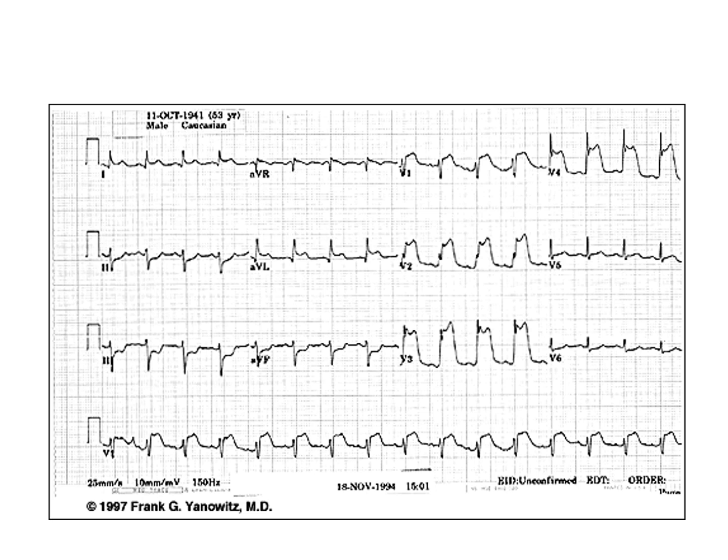So this is an example of a predominantly anterior MI. So if we look at leads V1 to V4, we see very prominent and large ST elevations. Now again, as we mentioned, the mirror image of the anterior field would be in the back. So the posterior leads, which we don't routinely do, but if we did a 15 lead, we would expect to see some ST depressions there. In addition to this, we can also see some minimal ST elevations in leads 1 and AVL, and then some mirror image ST depressions in the inferior leads, so 2, 3, and AVF.